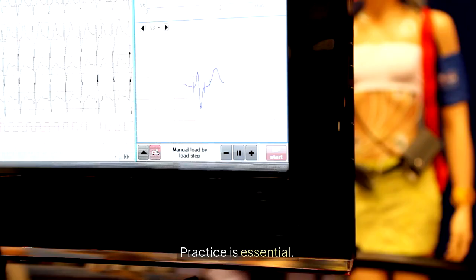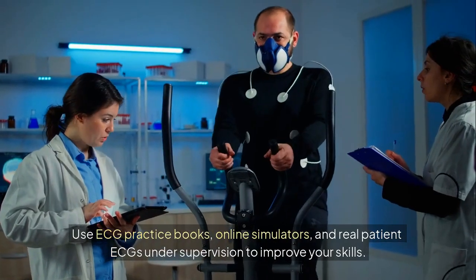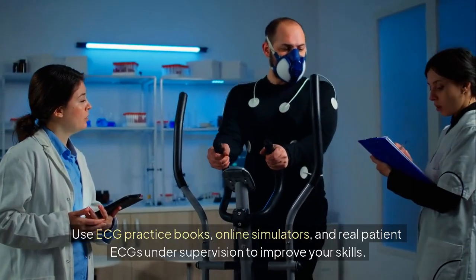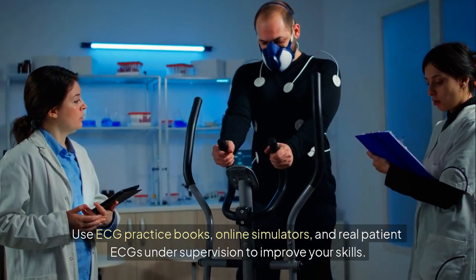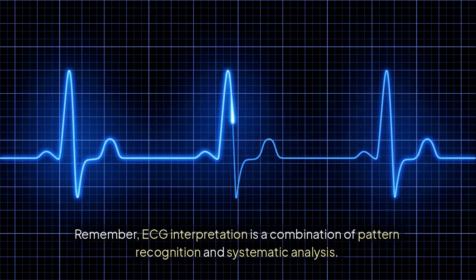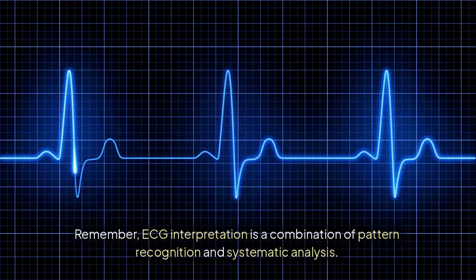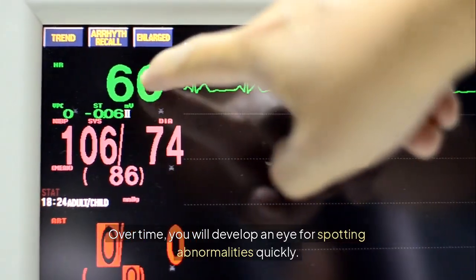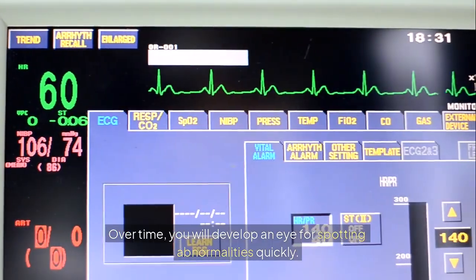Practice is essential. Use ECG practice books, online simulators, and real patient ECGs under supervision to improve your skills. Remember, ECG interpretation is a combination of pattern recognition and systematic analysis. Over time, you will develop an eye for spotting abnormalities quickly.